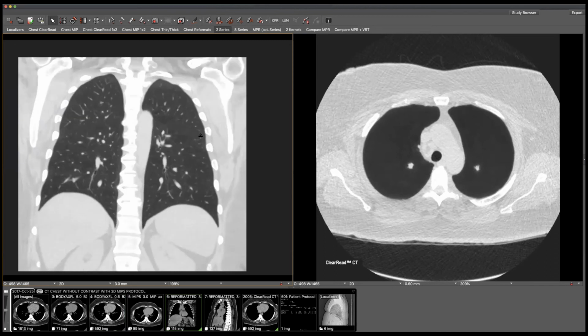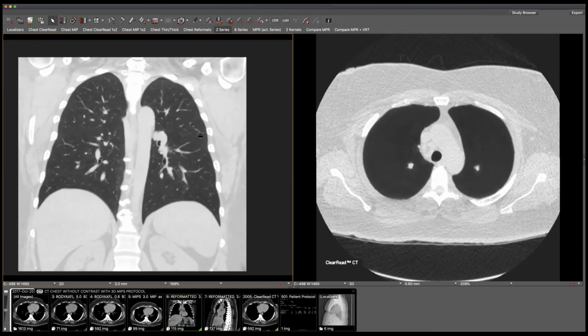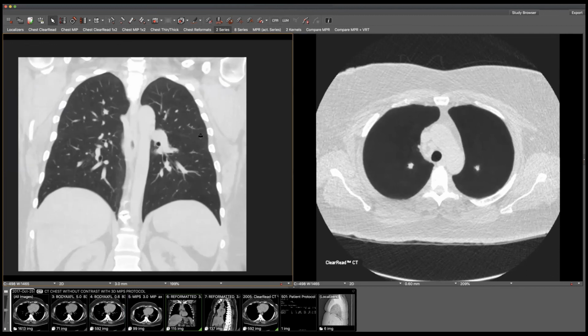So in this particular case, again, this patient has a history of breast cancer. She went on and had a short-term follow-up, and of note, the nodule on the right, which happened to be larger, actually went away, but the nodule on the left continued to enlarge, and this was actually found to represent metastatic breast cancer. So again, a very nice example of the utility of a machine learning algorithm for nodule detection.